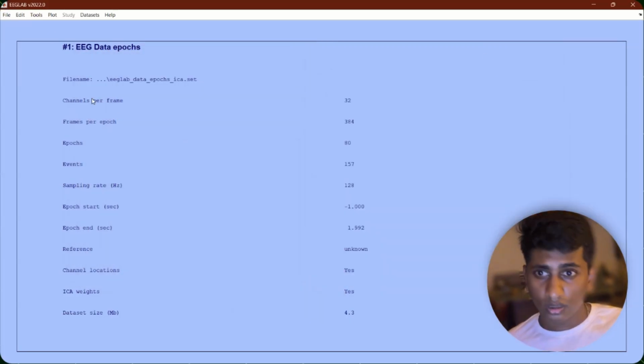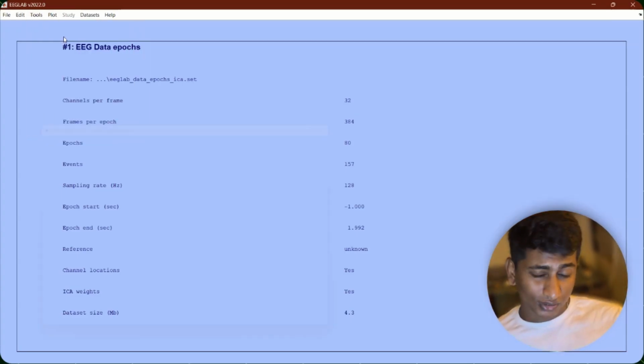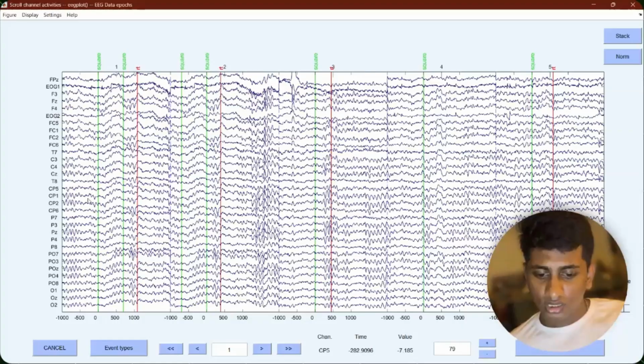Fine, so this is that. Next we'll go for the raw EEG signal, what we are seeing, so that we can scroll the signal. I'll show you the data. So here now you got the point. You'll get an idea what these are. So here are the raw traces, with event markers and all.